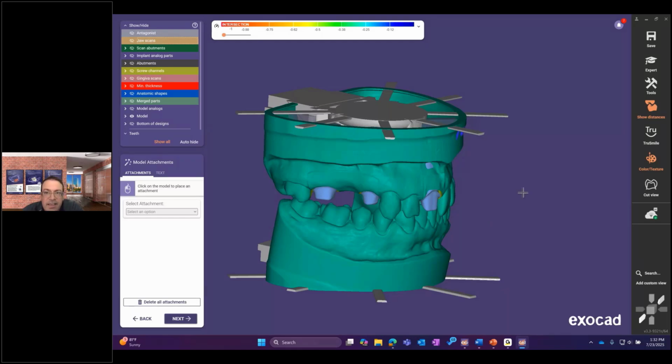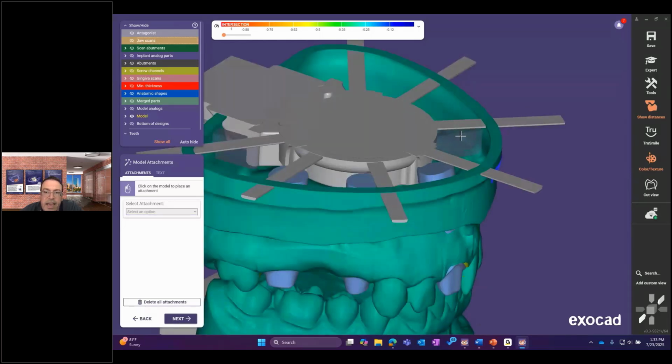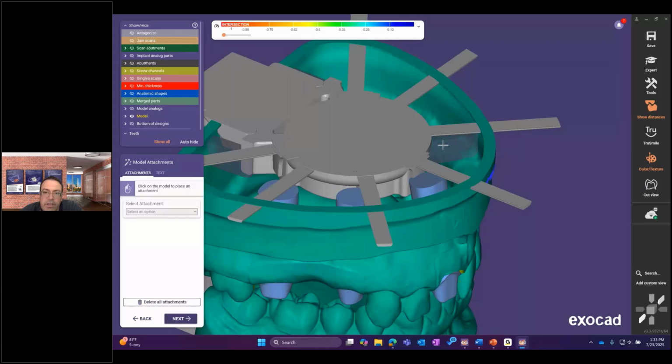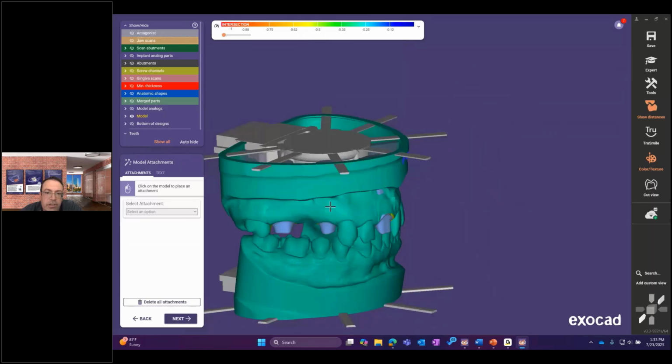Cool. All right, so we're almost finished with our model design here. So let's take a look at the attachment here. The Gerbach print and click attachment is selected already. So it's kind of a complicated attachment. We have both additive and subtractive components for this attachment. Where this gray surface is, that's going to be subtractive cuts. So there'll be some notches up here. And then there'll be some support arms, the transparent beams down there, to support the structure in the middle.